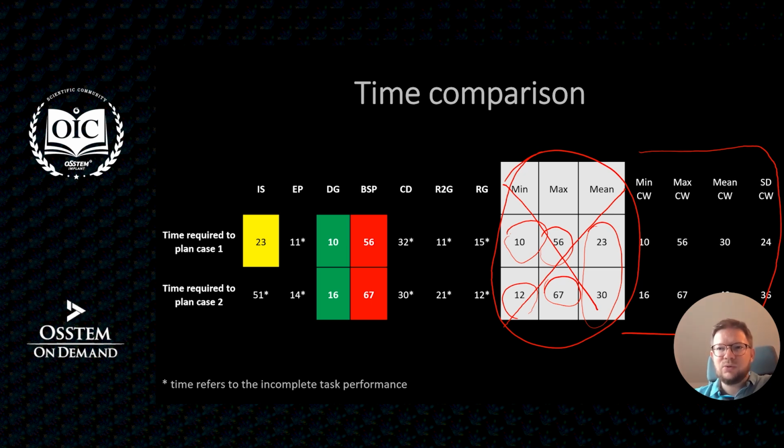we can compare only these 3 softwares here. It's Implant Studio for single crown design, because case number 2 was not able to be performed completely in that software. Then we have Dentic Guide available for both cases, and Blue Sky Plan also available for both cases.